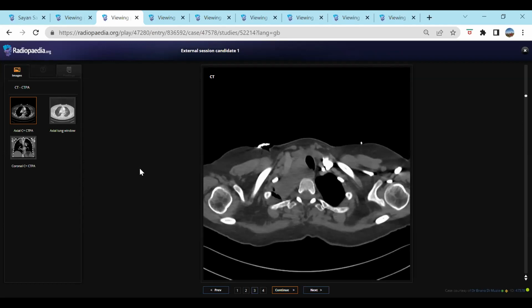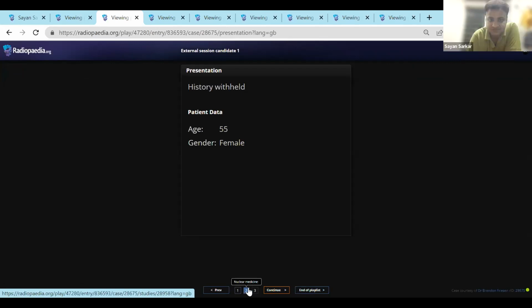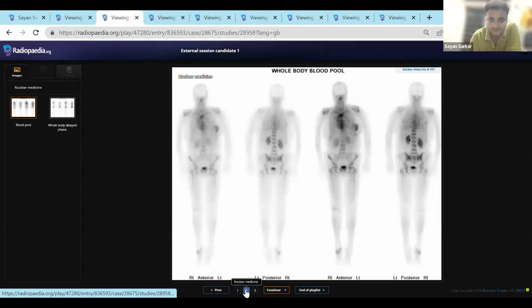Cystic nodule, or that much larger cystic nodule. Maybe it's a necrotic nodule or necrotic lesion. Other possibilities. Next case. This is your last case, okay?